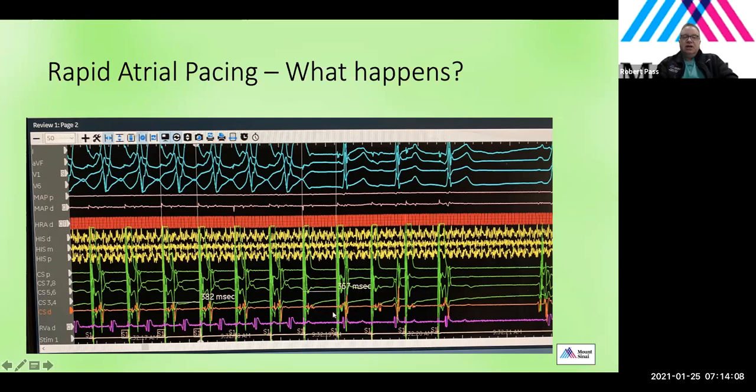So this would not be considered a high-risk pathway in terms of pre-excited, rapidly conducted atrial fibrillation, based on the so-called SPERRI, or the shortest pre-excited RR interval. So the SPERRI would be 370, or actually I guess 380. Below that, it does not conduct. So that was important information at the start of a procedure, because we know that if we are left with the WPW, the patient is at least not at risk for sudden cardiac death. So that's a positive.